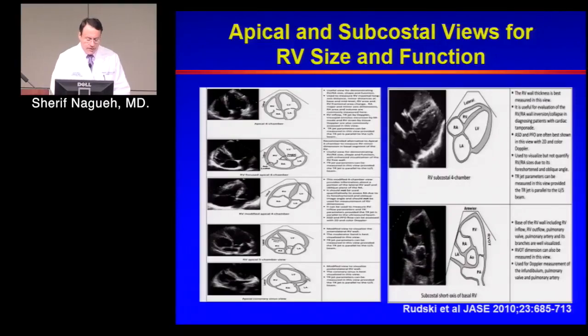The two other views that you see below, one gets you part of the aorta, so more of a 5-chamber view, and that one shows the moderator band. By the way, when you trace the cavity of the RV, any trabeculations and the moderator band become part of the cavity, not part of the wall, when you do your measurements. And then there is another view that can show you the coronary sinus, of more importance in certain diseases, but for most diseases, not really critical or needed.